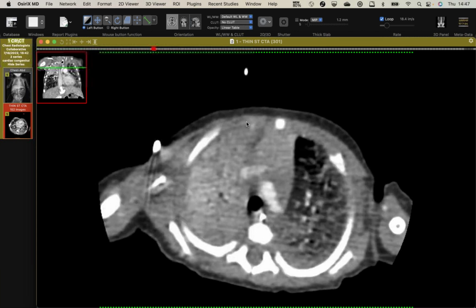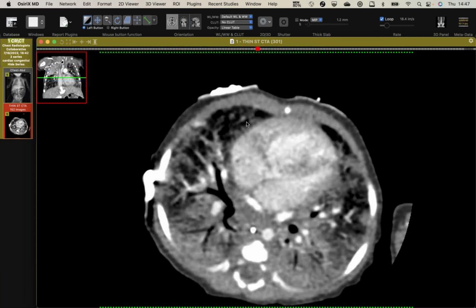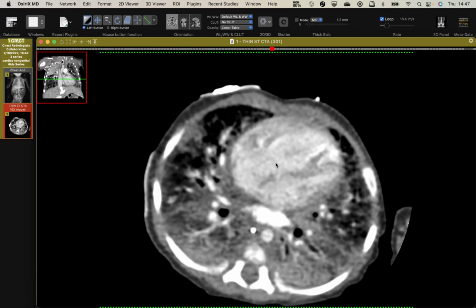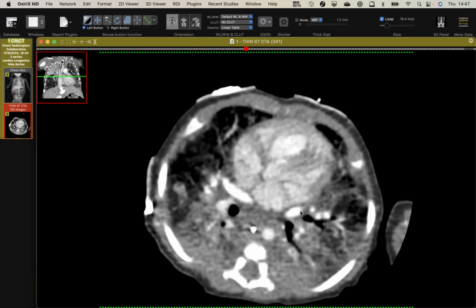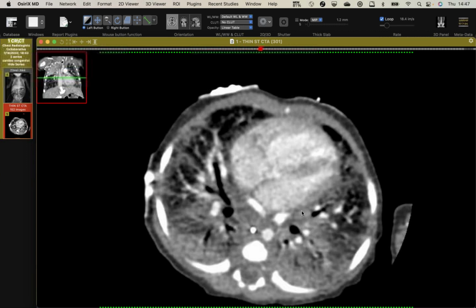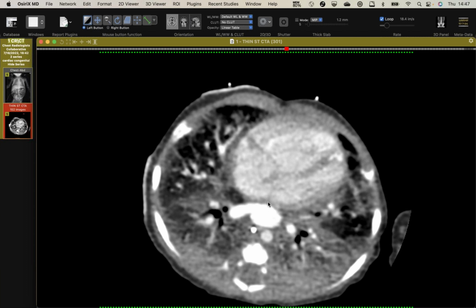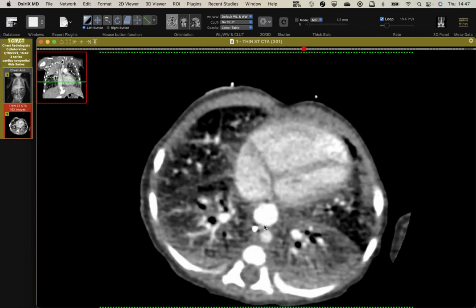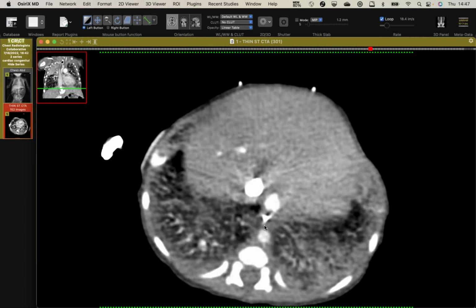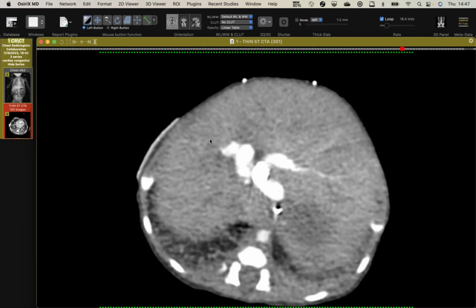So you see there's a left aortic arch, PA is big. We go down here, you see the right heart is a little dilated, but follow the pulmonary veins in. Here are the superior and inferior veins coming in, and you can follow them down into this vessel here, and of course it's separate from the left atrium. And then this heads south. It gets a little narrow right at the diaphragm, and then extends into the upper abdomen.